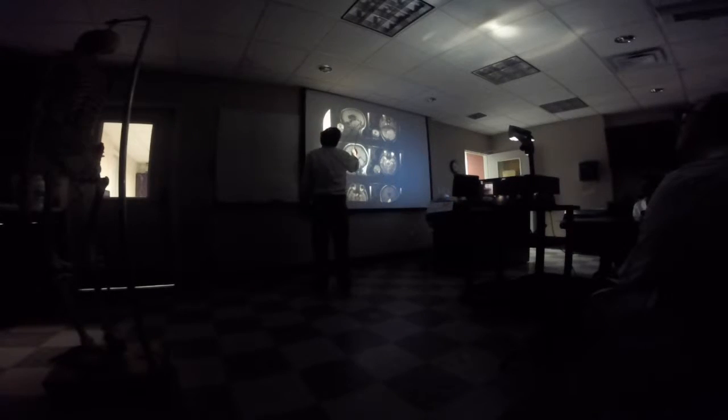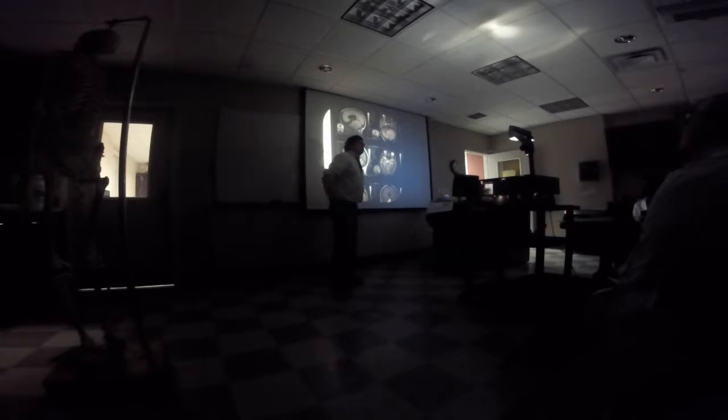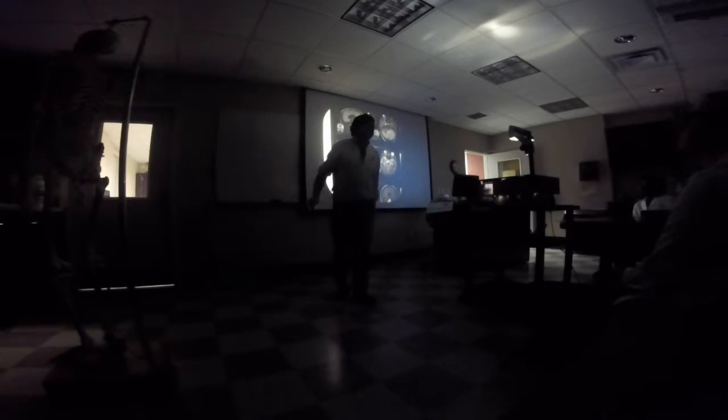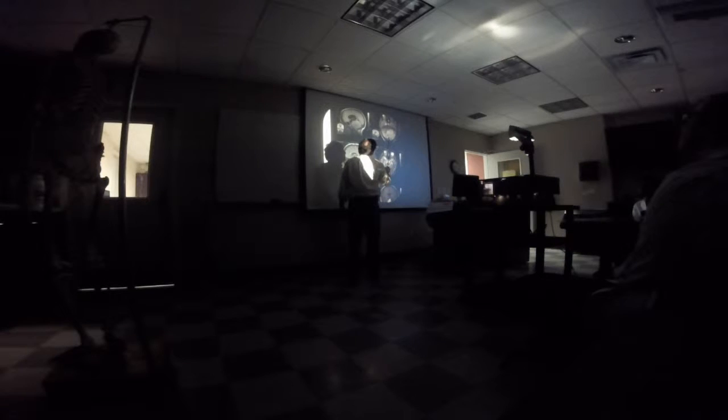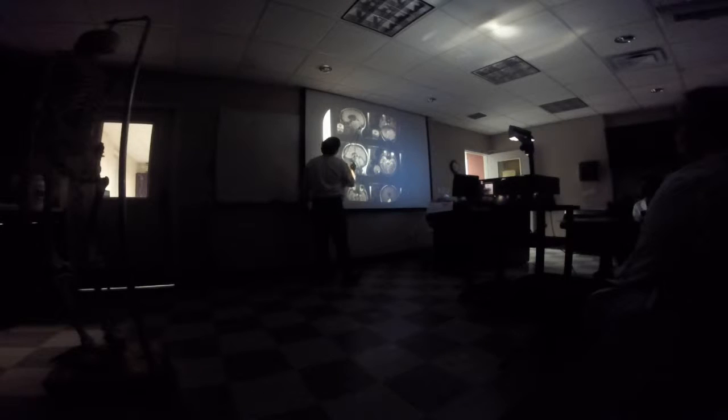Where is that tumor? Occipital. No, not occipital. That's in the cerebellum. Here's the occipital lobe. This is the location of the tentorium. This here is below. This is the posterior fossa. This is a cerebellar astrocytoma. Where's the tumor? The tumor is located primarily within the right hemisphere of the cerebellum. That's huge. Okay, so here it is. Here's the cerebellum over here. Remember, it piggybacks over the brainstem.